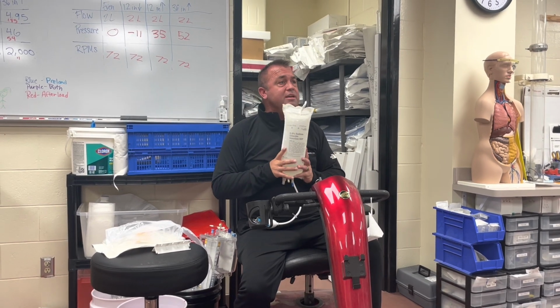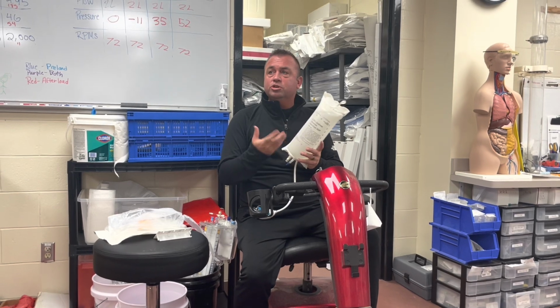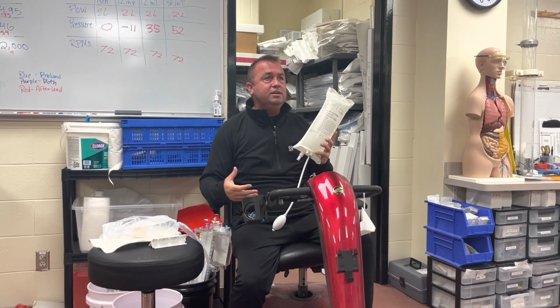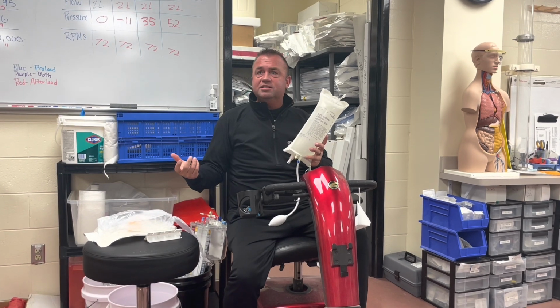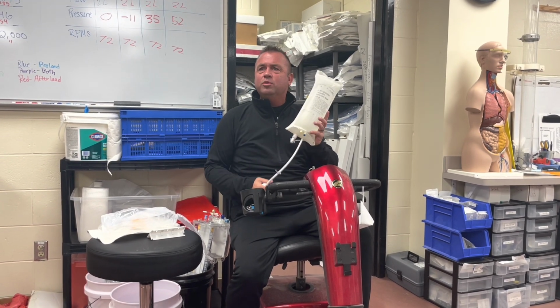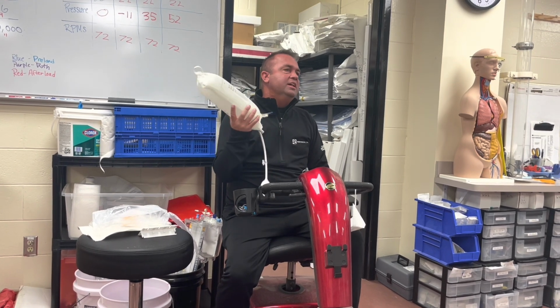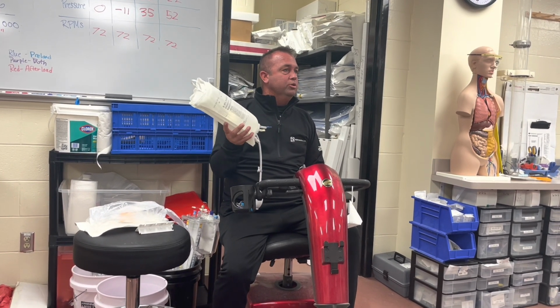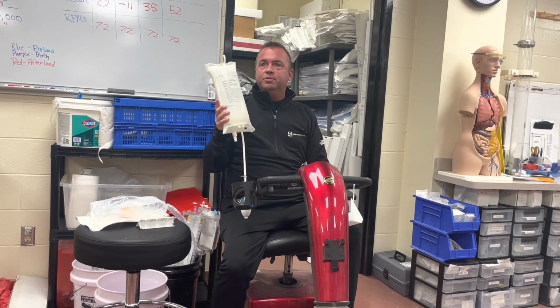What was good for me is it really taught me how these things work. And it got me exposure to using these systems and to figure them out. So that when I'm drawing samples or things like that in different kinds of cases, I really understand how the thing works, or I can see, hey, I need to blow it up and things of that nature. That's why we go over this for you too, in case you go to a place where it's your responsibility to set these up. Maybe some of you have in previous jobs or anything.